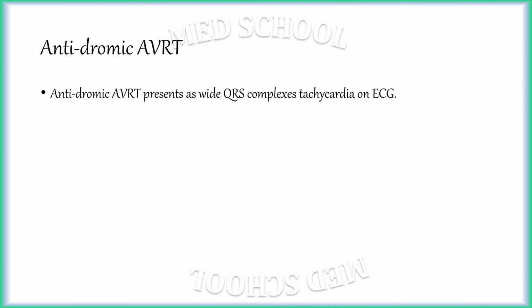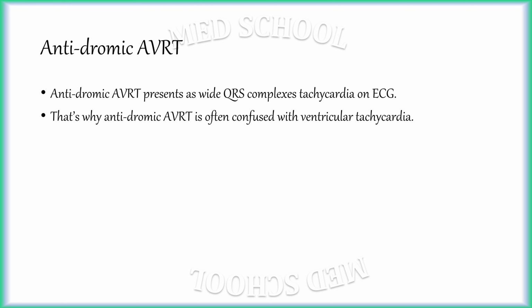Antidromic AVRT presents as wide complex tachycardia on ECG. That's why antidromic AVRT is often confused with ventricular tachycardia. Brugada's criteria is designed to solve this problem.